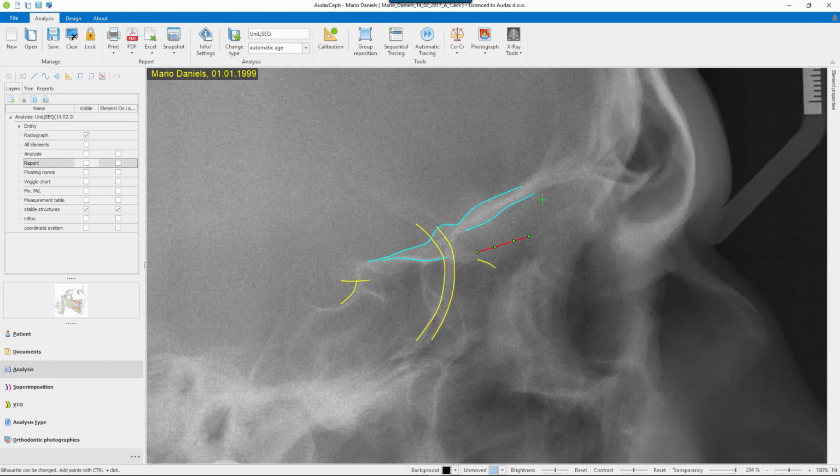Certain structures are more important to ensure accurate sagittal orientation, while others are more important for vertically orienting the cranial base superimposition. The primary structures for sagittal orientation are first the contour of anterior wall of sella turcica, and second the greater wings of sphenoid. So these three structures. The primary structures for vertical orientation are first the intersection of anterior wall of sella and anterior clinoid process, so Walker point, this cross section here.